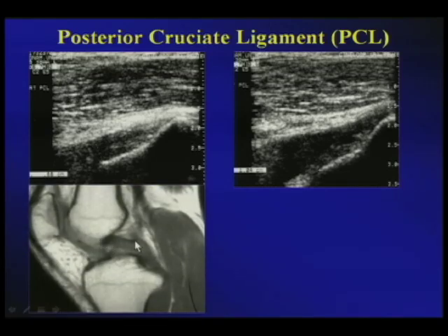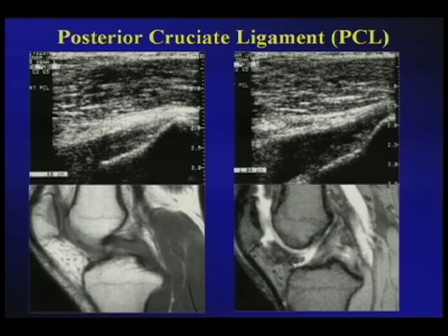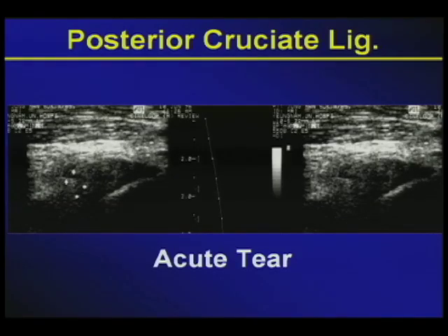Here, instead of a black ligament representing the posterior cruciate ligament, you see that it's got increased intrasubstance signal abnormalities. On a fluid-sensitive sequence, you could see, comparing it to the intact anterior cruciate ligament, that the interruption of the posterior cruciate ligament shows this increased signal abnormality representing the hematoma. I'm going to skip this and go to conclusion.